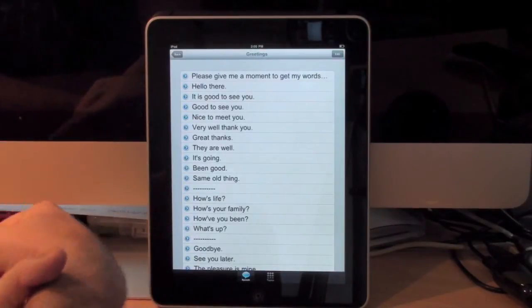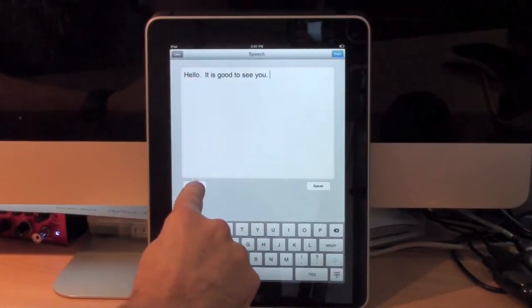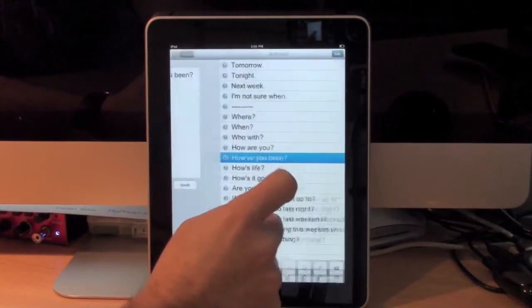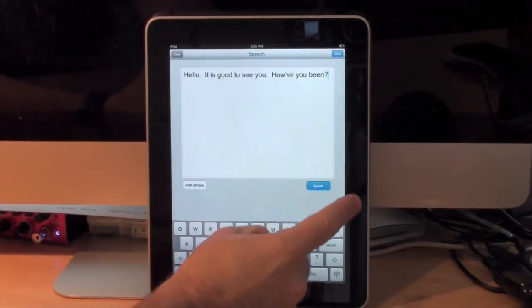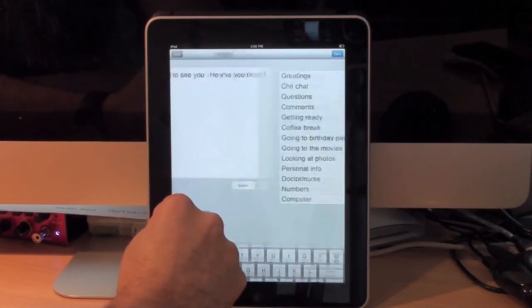And let's suppose I'd like to add this one here. Now it says hello, which I typed in. It is good to see you. And let's suppose we want to add another phrase to our text box. And I'll choose, how have you been? There, hello there, it's good to see you, how have you been? Now I can hit my speak button if I want. Hello, it is good to see you. How have you been?